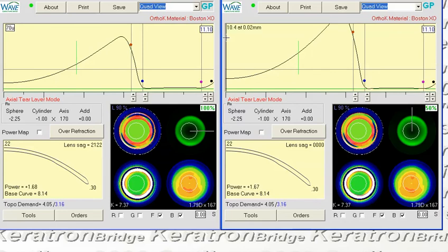Now we're at 10.4. I usually try to go about 5 microns at a time. If we vault the cornea too much all at once, we sometimes get unexpected treatment results, even inducing central islands, which generally makes the patient quite unhappy because they can end up being more myopic than when they started. So I think 10.4 is a good amount there.